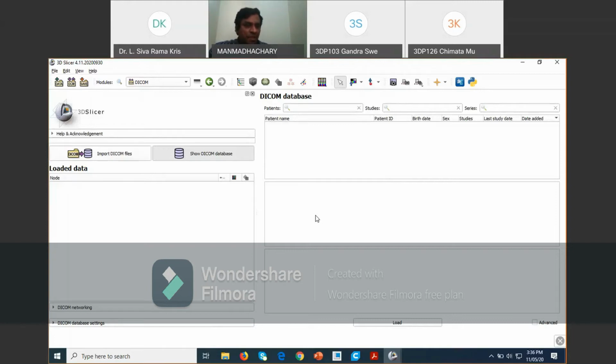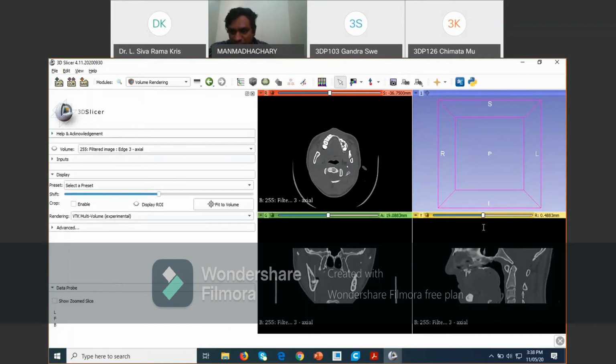Next, go for the volume rendering module. Yeah, okay. Yeah, it's good, sir. Good, sir. Prabhu, Vivek Prabhu, sir.